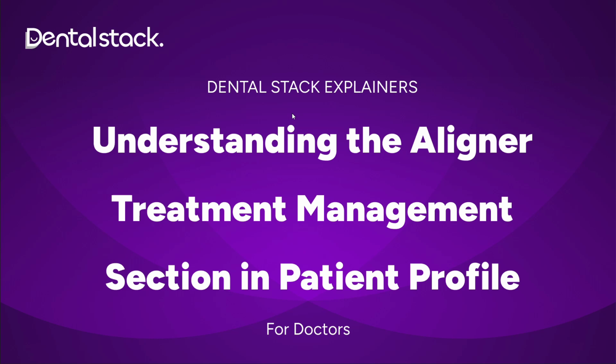Here you'll find comprehensive details about your patient's treatment progress. Let's get started.